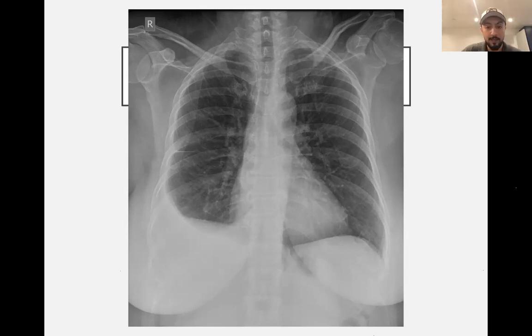So that's good. Now, the prominent markings of the lungs that you mentioned, they are indeed more prominent, and that is possibly a sign of pulmonary edema, because in pulmonary edema you can see some patchy consolidation that is widespread across the lungs.